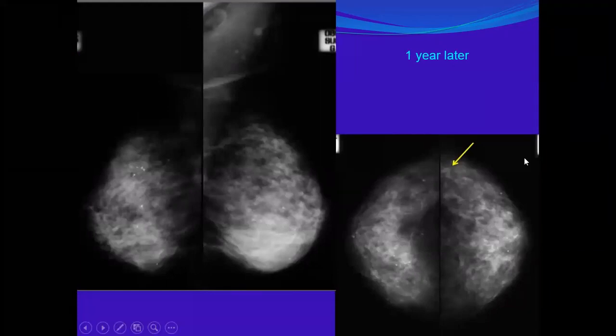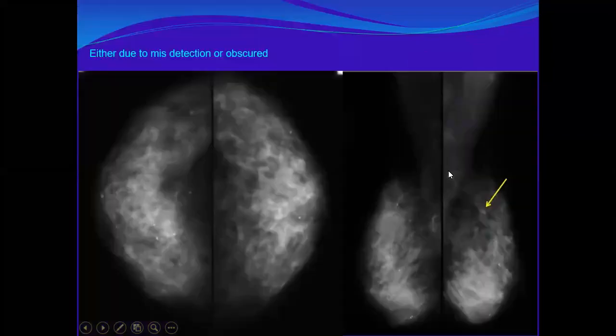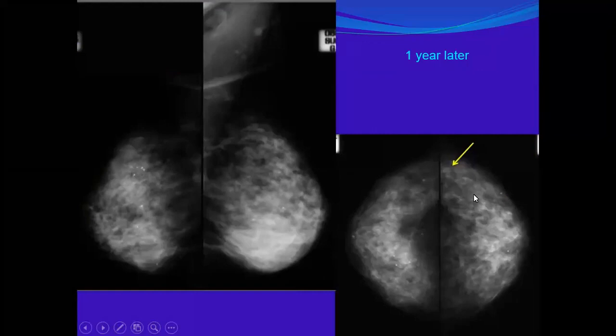So as you mentioned, same, you describe it here, you suspect it, it is there, yes. Now we consider it, but less well appreciated. Yes, it is seen here, but not the same as the previous. What do you think is the cause for that?